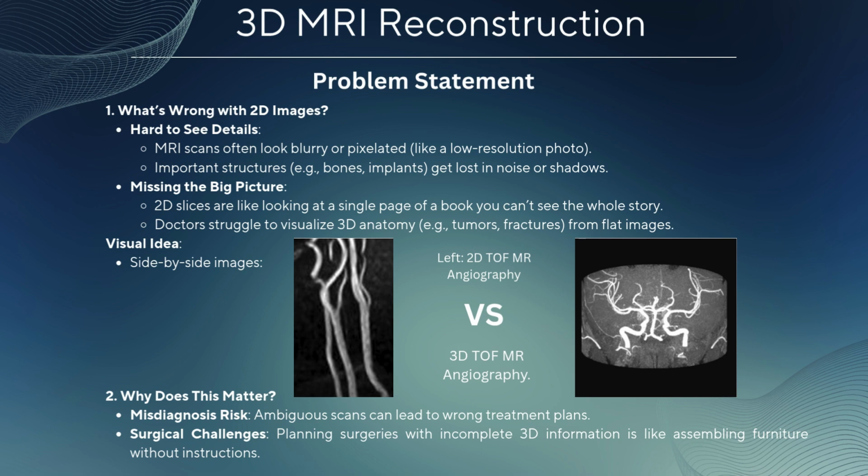The 3D counterpart overcomes these challenges by having a superior resolution. Isotropic voxels capture equal detail in all directions, like a high-definition sculpture instead of stacked paper cutouts. It also has comprehensive coverage, so a single 3D acquisition captures an entire volume with no gaps or misregistration.